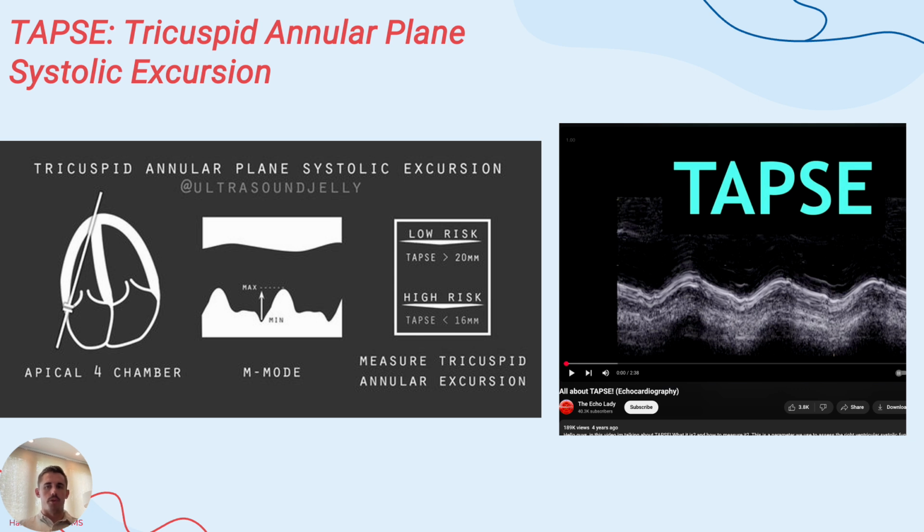So TAPSE is important. A couple studies have shown that it's an independent predictor of increased risk for 30-day mortality in patients with acute PE. It's also predictive for poorer perioperative outcomes.